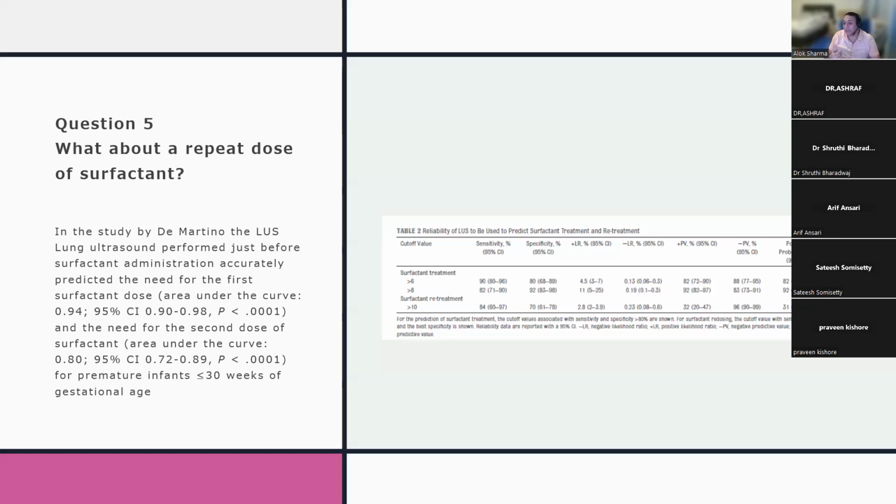They may well have a pneumothorax that might actually be causing the oxygen requirement. They might have pulmonary hypertension as well. So it's really important that if you're doing a repeat scan, you're trying to exclude any of the complications that might occur. Is this surfactant in the endotracheal tube that's caused the blockage? And that's why you have such severe whiteout and atelectasis in the lungs. All of these things are really important. Is the tube down the right main bronchus? Is it that the right lung has received more surfactant and the left lung still looks a whiteout?